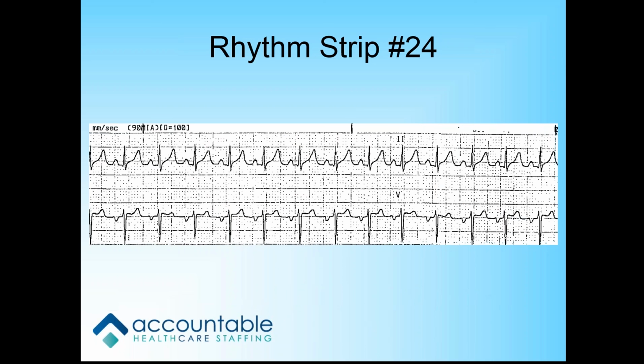Irene. Okay, this one's yours. Sinus tach. Sinus tach, exactly. Can you walk everybody through how you got to sinus tach? I counted the rate. It's 1, 2, 3, 4, 5, 13 times 10 is 130. Right. Then there are P waves to every QRS complex, and it's regular. Yes. Makes it sinus tach, right?